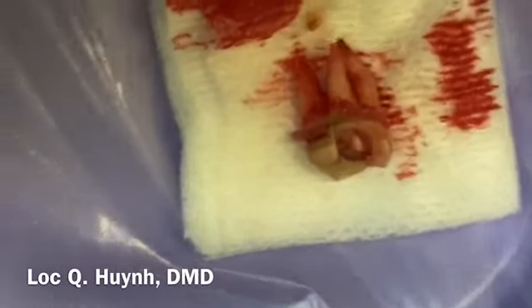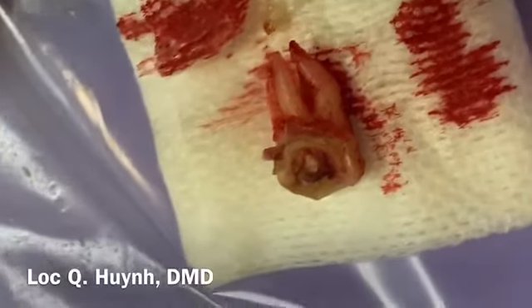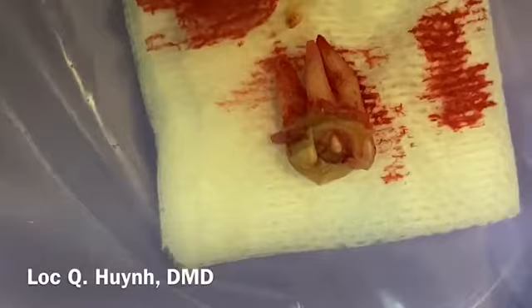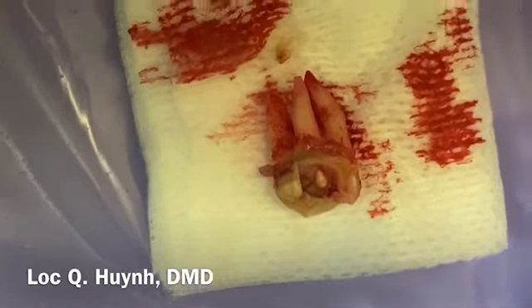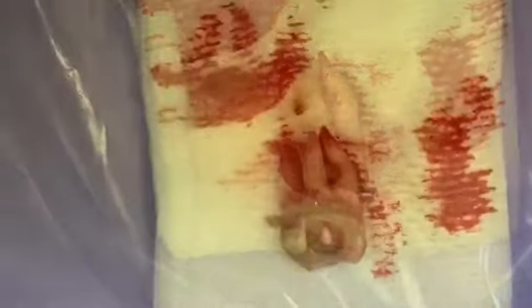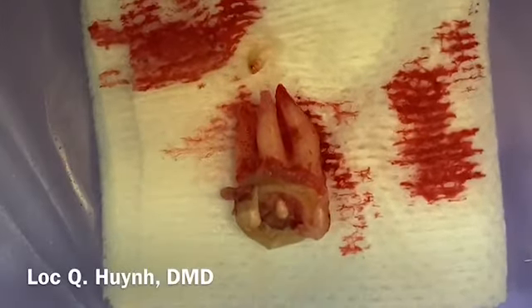I hope you enjoyed this and see how you have to look at the wisdom tooth, especially in a young patient. You have to look at the area in the back. Sometimes you focus on the bitewing and miss the possibility of distal decay of tooth number 1, or number 32, or number 16 or 17. These are important spots to be looking at.